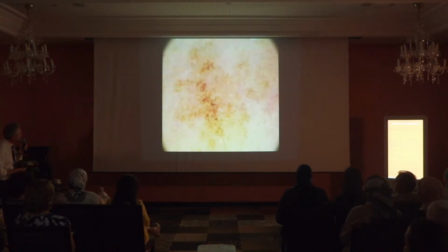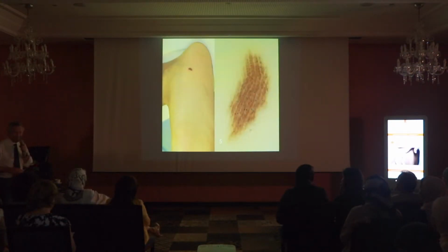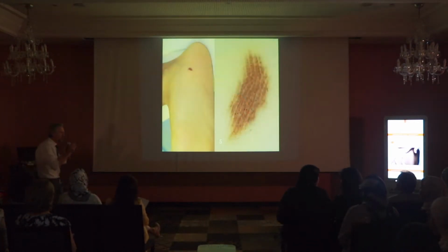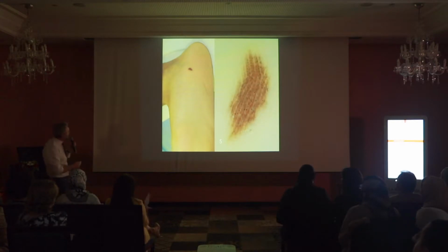Okay, so this is melanoma and this is benign. I'm very sorry. The 3 is melanoma, and the 4 is solar lentigo. Nevus 5, number 5, nevus? Perfect. Double line. You see here? This is the furrow, and this is double line. You see double lines, especially in congenital nevi of the acral side. So this is benign.